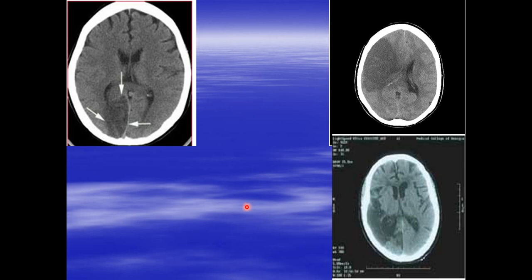According to what we have said, if an artery is occluded, the part of the brain that is supplied by this artery will be edematous and will go into infarction. You have a cerebral infarction at this part of the brain. So we can know which artery is involved according to the location of the abnormality. We talked extensively about the CVA, the cerebral stroke. So we will just see the abnormality here and which arterial territory it is.